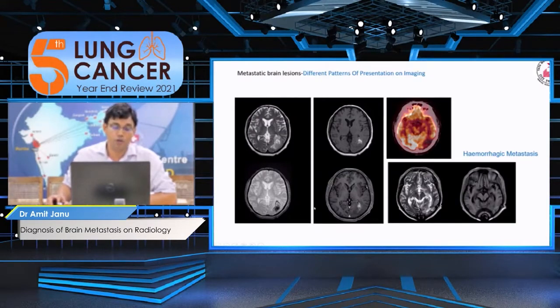If we have a solid nodule apart from the area which is bright, it will tell you that probably there might be a metastatic disease. So this is the solitary lesion which progressed over time, and then it was resected, and the patient is doing fine.